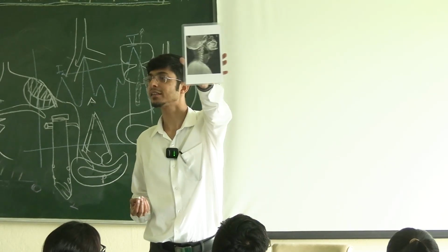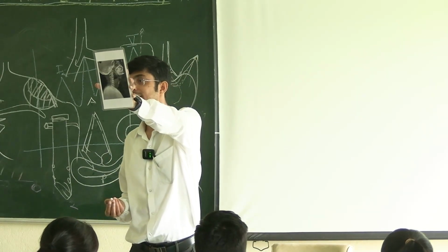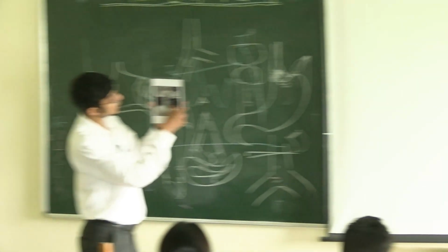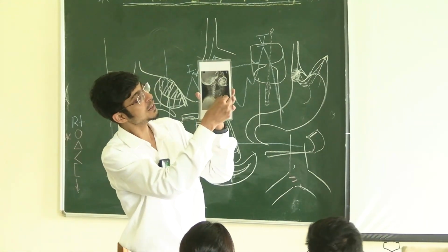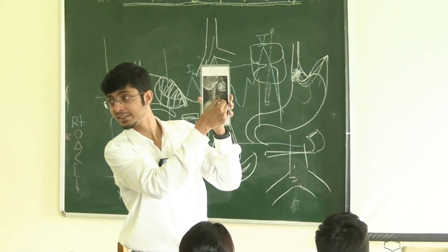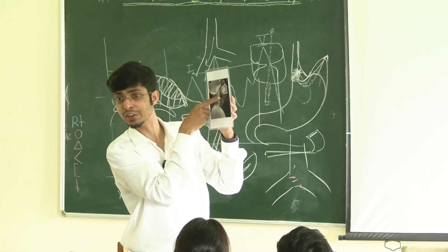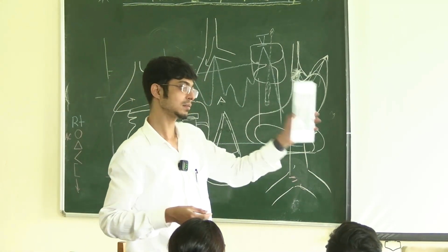Can you appreciate? Can everyone understand? It's seen very nicely, you don't get to see it this nicely. See, this is the airway anteriorly. Let me go a bit closer. So this is the airway of the trachea anteriorly. So behind that there is the esophagus, and the abscess is retropharyngeal. So it's behind the pharyngeal wall. So what is the cause of a retropharyngeal abscess?